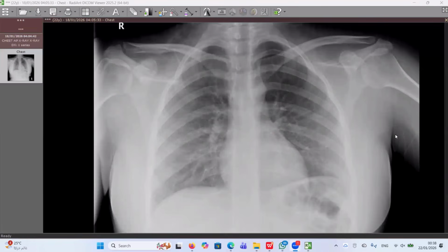Both lung fields. Please check both lung fields, searching for any consolidation, collapse, nodules, masses, cystic changes, reticulations. And don't forget the lung apices and the bases of the lung. Sometimes you can find pulmonary opacity or pulmonary nodule projecting over the diaphragmatic copula.